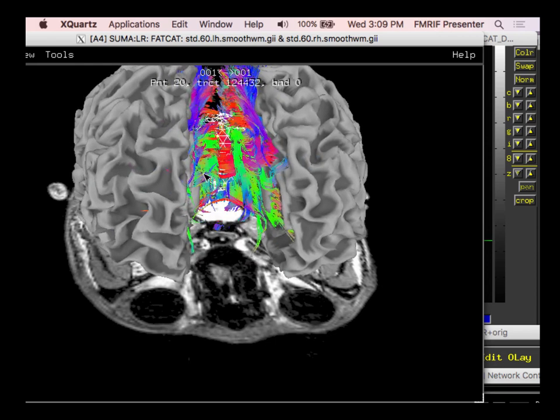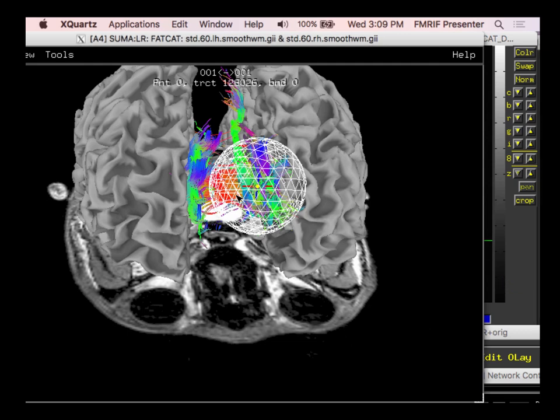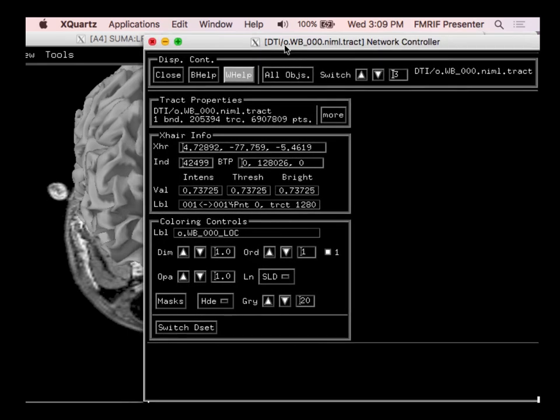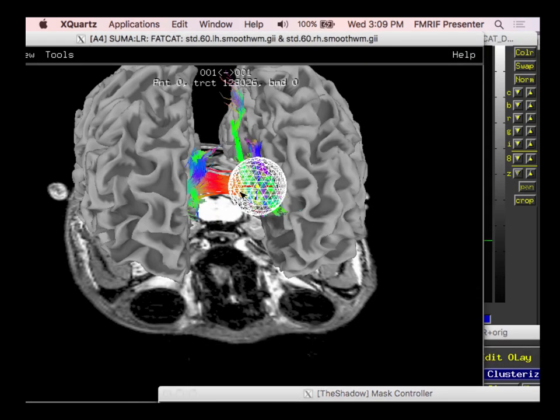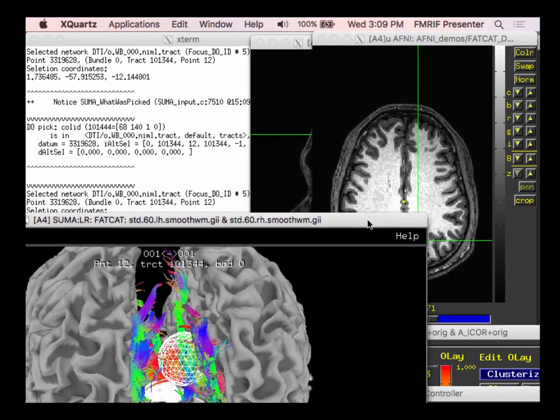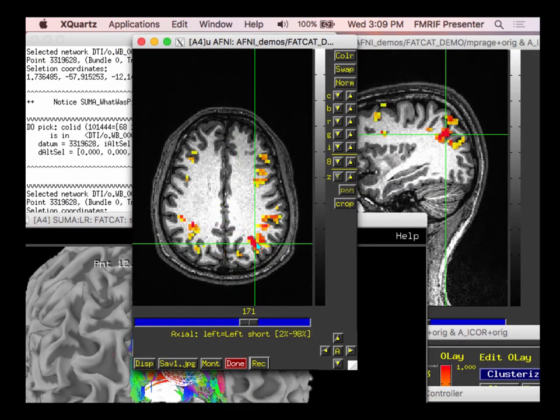And we showed before that what I can do is I can click around and look for where there are tracks related to what I have. A bit smaller. So this shows me the kind of structural connections that are going through here. In my functional data, if I click around here, I'm looking at where parts are functionally related.